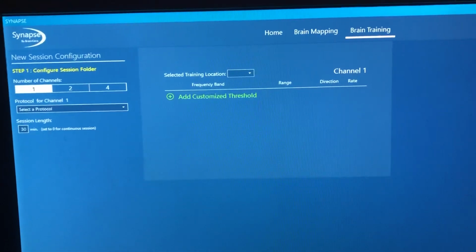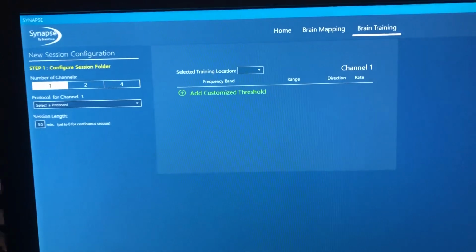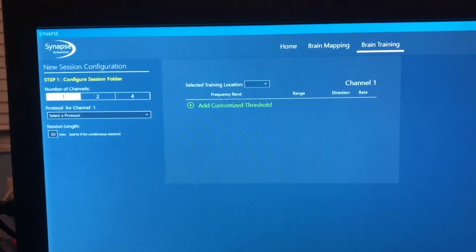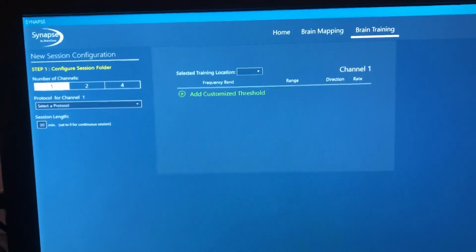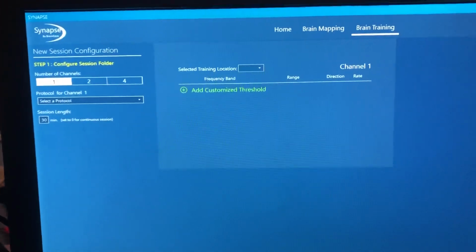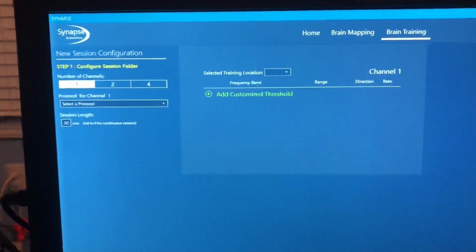Hello ladies, in both practices I just wanted to make a quick instructional video on making a custom protocol because I'm going to be asking you to do that with certain patients. So here's our Synapse program, which you're all very well familiar with.